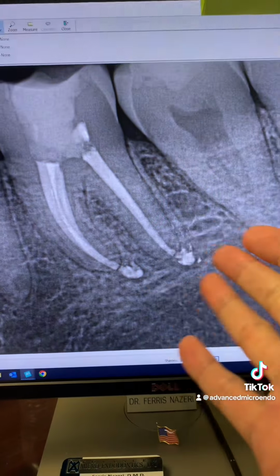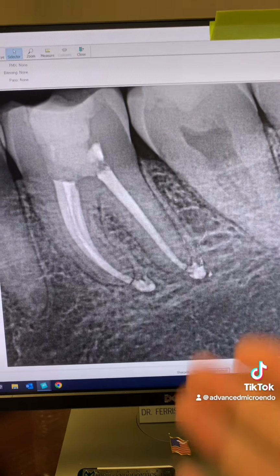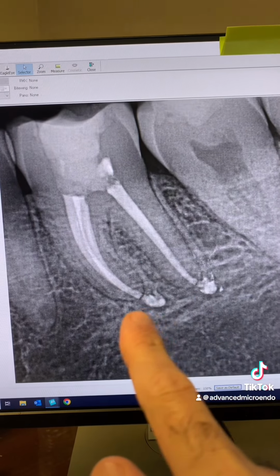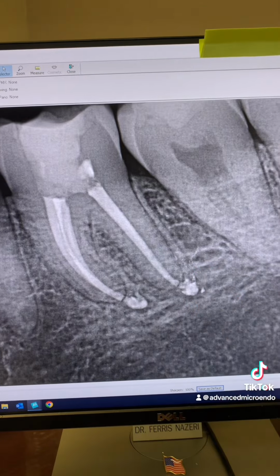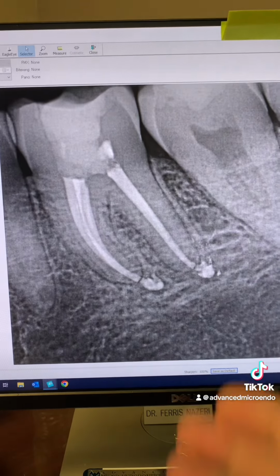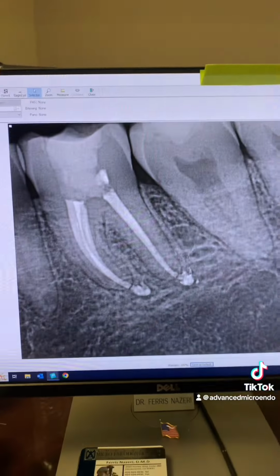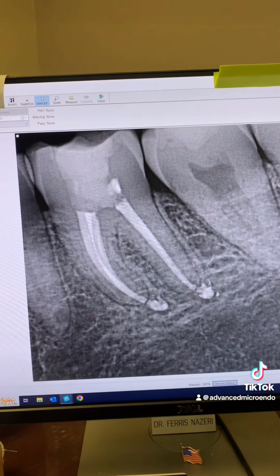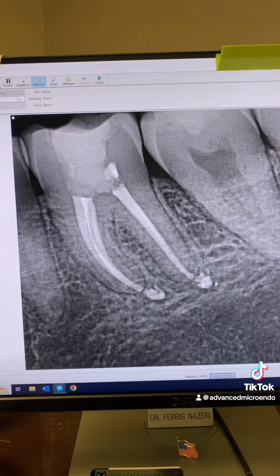And this is another angulation of the tooth today. So again, you can see the large periapical lucency associated with the mesial roots, and the periapical lucency that was associated with the distal root, they've healed completely. And again, here's the date. All right, so a year and a half, almost a year and a half post-op of tooth number 30.